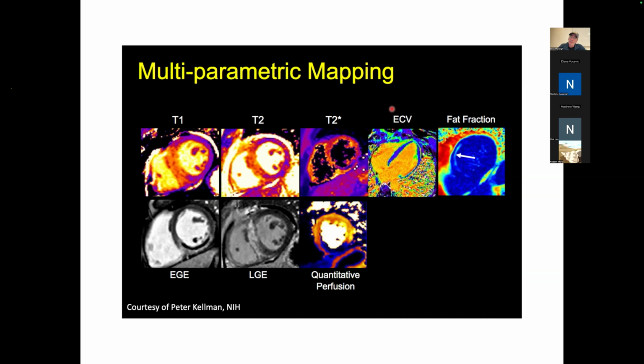You can compute things like extracellular volume fraction. And so looking at a change, here you can see the extracellular volume fraction in this tissue here has shot up. And so that is equivalent to this amount of fluid that's outside the cell. And it's a way to really quantify the amount of swelling of that tissue, or edema.